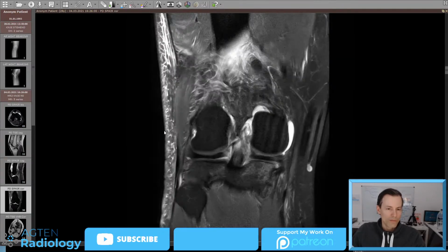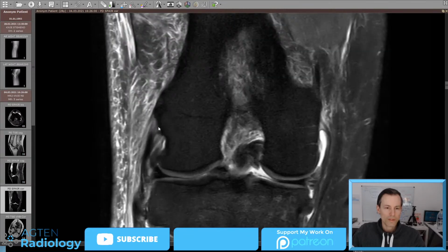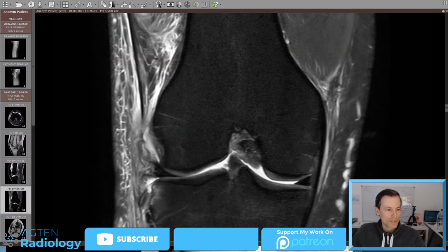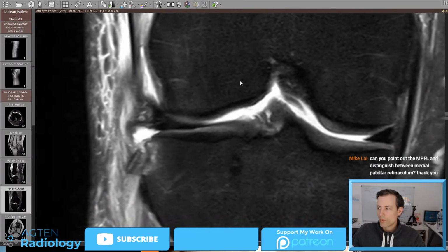We can now try to verify this on this kind of coronal image here. So this is now posteriorly going anteriorly. We can see this kind of, now this was posteriorly and this is anteriorly. Okay, so here, somewhere here should be the ALL like this. Maybe better seen here, or maybe if you follow the video, it should have this kind of orientation. And what actually the second fragment should be is an avulsion of this meniscal or meniscotibial component, or the tibial component as it's sometimes referred to. So we can now try to think what actually is inserting here. It's really hard to see, right?